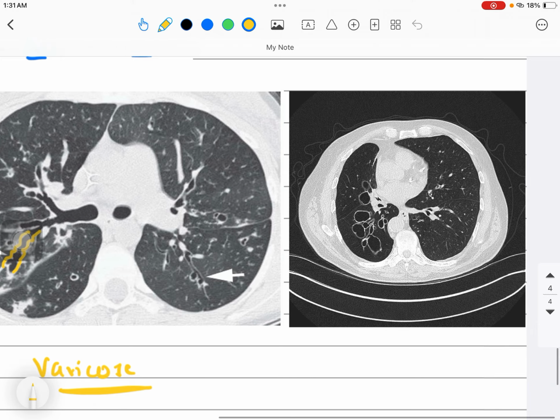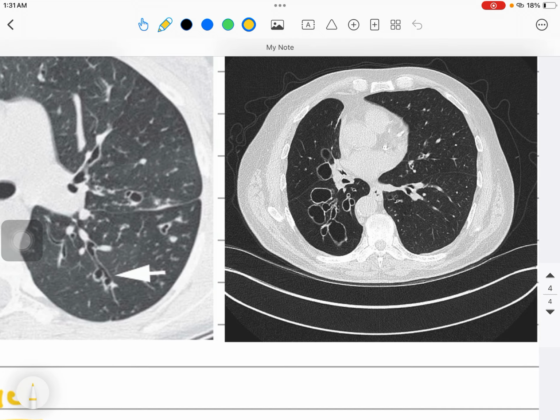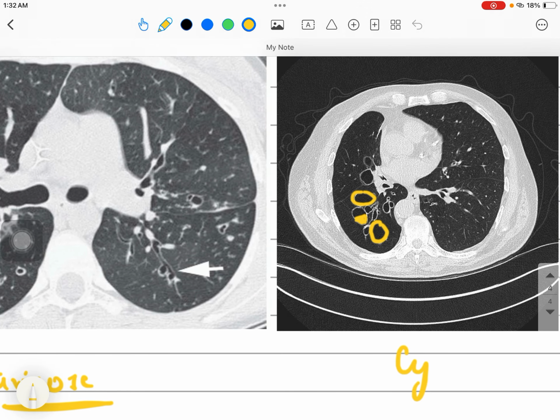And if you talk about the cyst-like appearance in the HRCT thorax, for example over here you can see a cyst-like bronchiectasis, right? Cyst-like abnormal dilatation of the airways, and sometimes mucus can be filled inside this cyst. Because half of the sac will be filled by the mucus and half of it with air, sometimes an air-fluid sign can also be appreciated in the cystic bronchiectasis overall. So this is the cystic bronchiectasis overall.